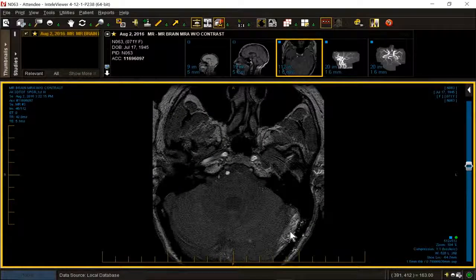Type 1: they're confined to the sinus, and they have antegrade flow, with flow along the direction of the sinus, but no cortical venous drainage or reflux. This patient does have cortical venous drainage and reflux. Type 2. 2A, confined to the sinus, retrograde sinus reflux, no cortical venous drainage.